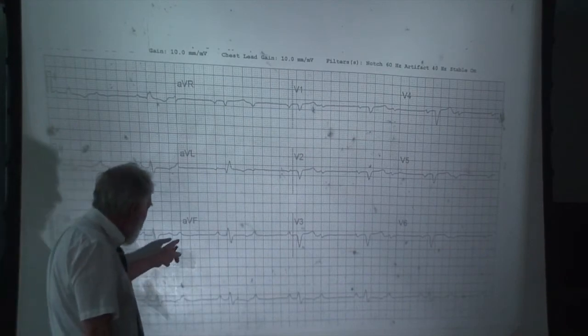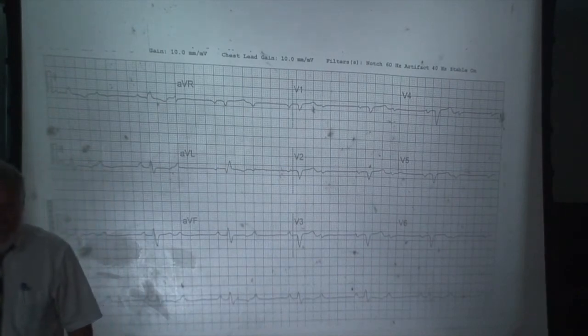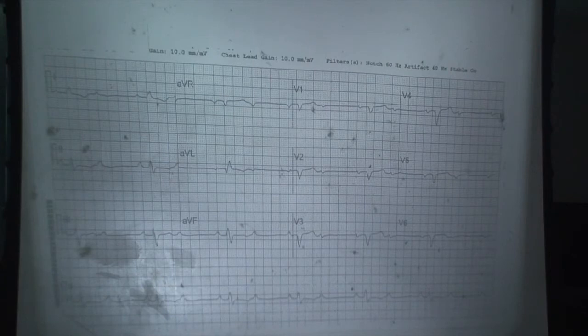This is not a benign condition though. What's the heart rate here? 30s and 40s, right? So, second degree AV block with a bradycardia might well lead to syncope or falling.